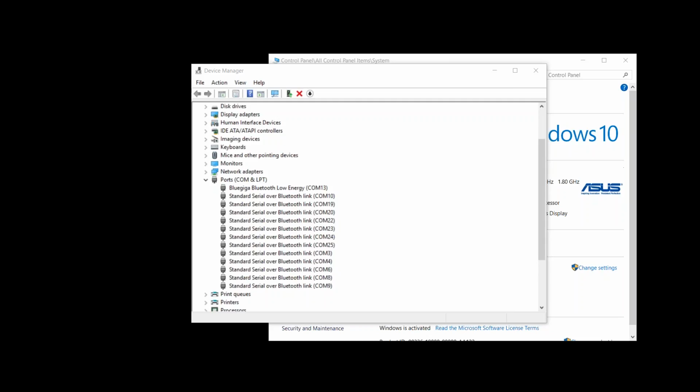The zones and the muscle fatigue threshold are specific. So for each sport, you can have your own zones and muscle load fatigue threshold. But problem detection does not take into account the muscle fatigue threshold. Problem detection only monitors your muscle load balance and the muscle relaxation values.